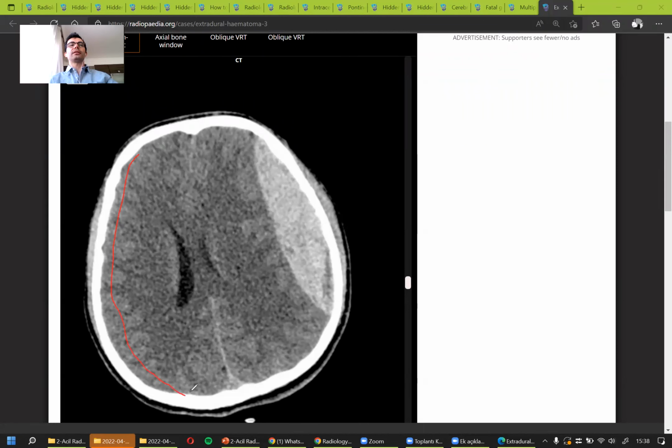It would be more flat, because in epidural, this is bleeding from the upper part of the dura, it is pushing the dura, which is sticking to the bone very firmly, and it has trouble passing to the other side, to the frontal bone, right? Because this is the parietal bone, this is the frontal bone, okay? So it cannot cross the sutures, which is very important.